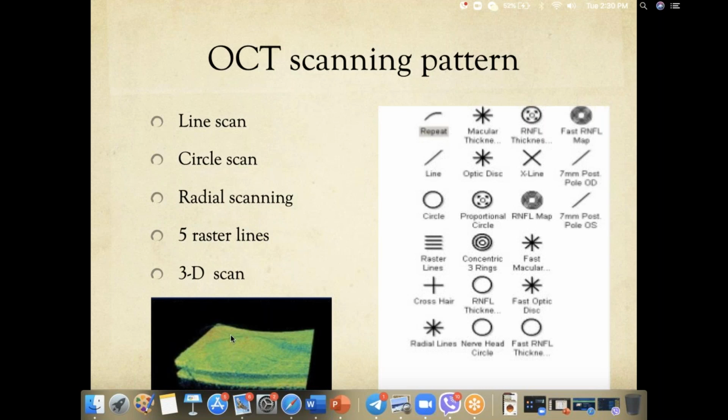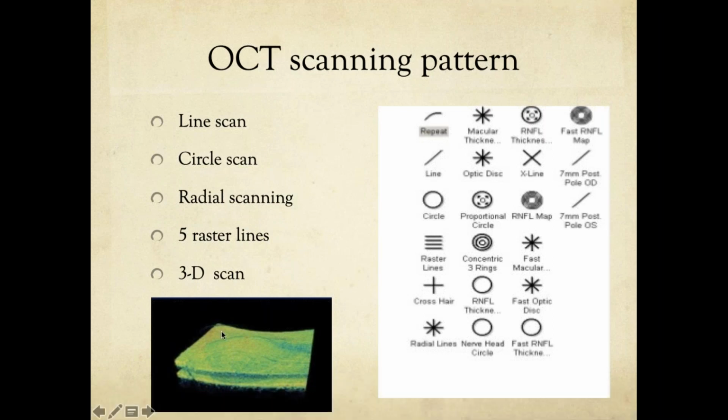Because if you have the highest macular thickness over here and you're planning to do a full 3D scan of it, well, that could be helpful, but what good information are you really going to get? Because it's just a CSCR.